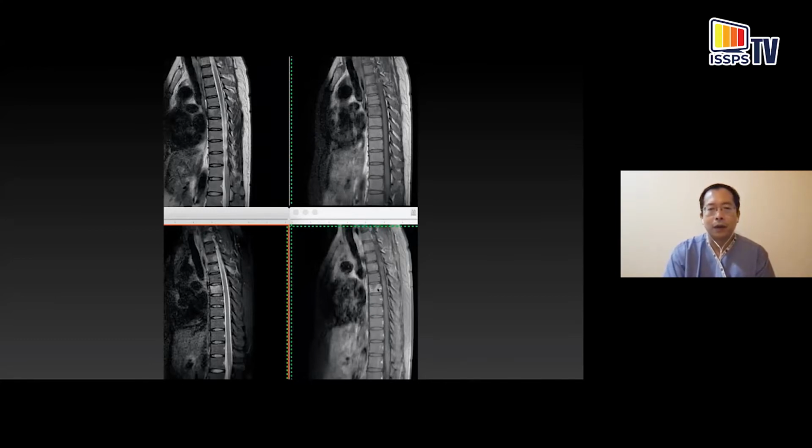And this is really the only reason why we will want to give contrast in the thoracic spine, or if there is abscesses. So it's abscess and tumors mainly. So once again, T2 weighted, T1 weighted, inversion recovery, and the contrast enhanced scans.